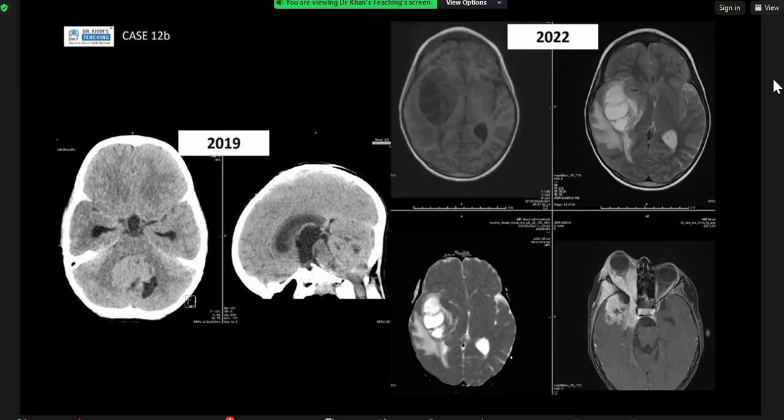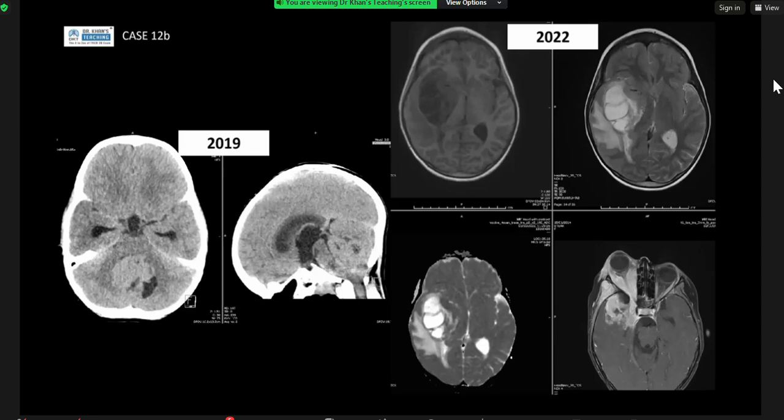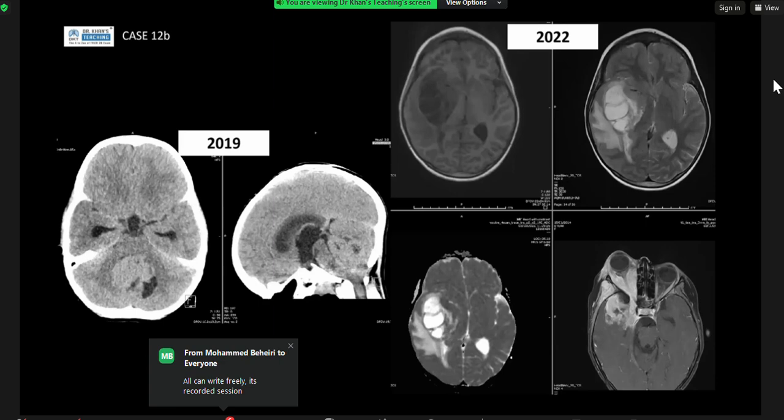Do you think that the lesion in the brain looks aggressive? How does that link to the lesion in the bone? If it were an adult, what would you be thinking? Is it a lymphoma? So the parietal bone lesion appears... If it had been an adult, I would have seen the temporoparietal lesion and I would have said it to be a glioblastoma.